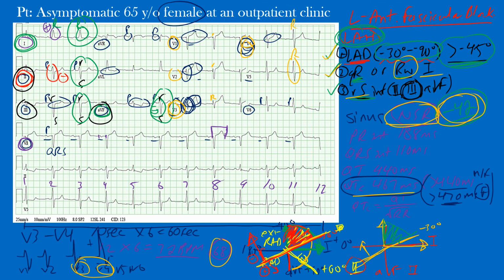That's this one here. We didn't mention this one, and that's likely an aberrant conduction that we see going on in that beat. You can see that this beat here is different than the ones next to it. Notice here, different from the complexes aside from it. So these are either fusion beats that we're seeing going on here, or it could be aberrant conduction, possibly coming from the right ventricle, but we won't get into that too much here.